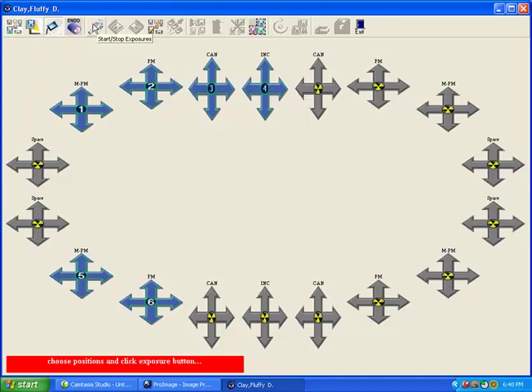When this symbol is clicked here, the first in the series turns red, this one here, and it's waiting for a radiograph. Right now I don't have live x-ray. I am running a live system, but we can't actually take the shot just now. Notice down in this corner we're counting down from 900 seconds, which is 15 minutes. So we have 15 minutes to radiograph this.